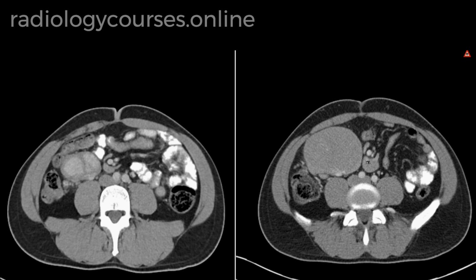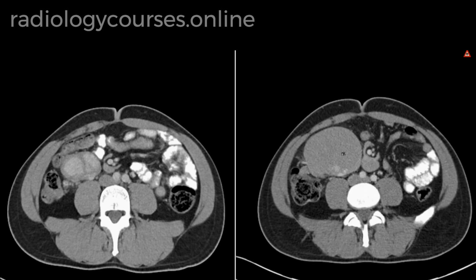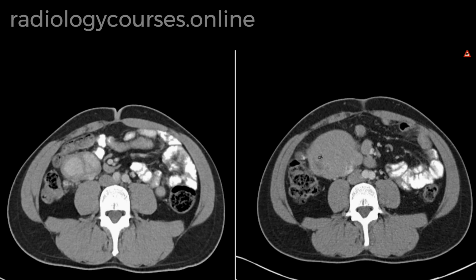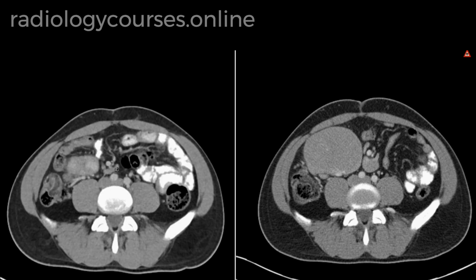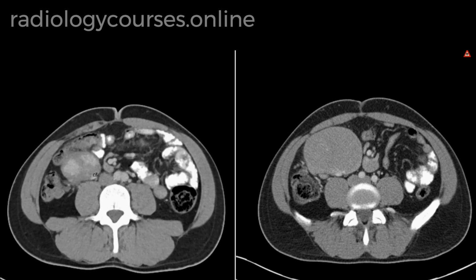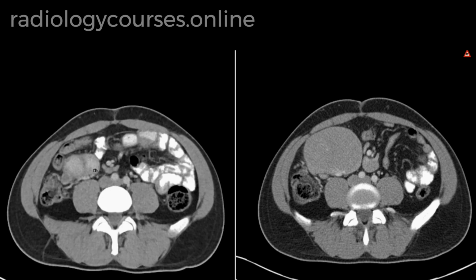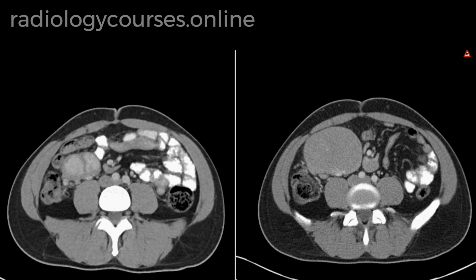But if you see the attenuation, on the previous scan, the lymph node was showing relatively homogeneous attenuation, barring a few tiny streaky increased densities and a small area of low attenuation in the posterior and lateral aspect. The current reduced nodal mass shows significant increased density or enhancement, almost filling the whole of the nodal mass, sparing the periphery. So, what is the reason for this?